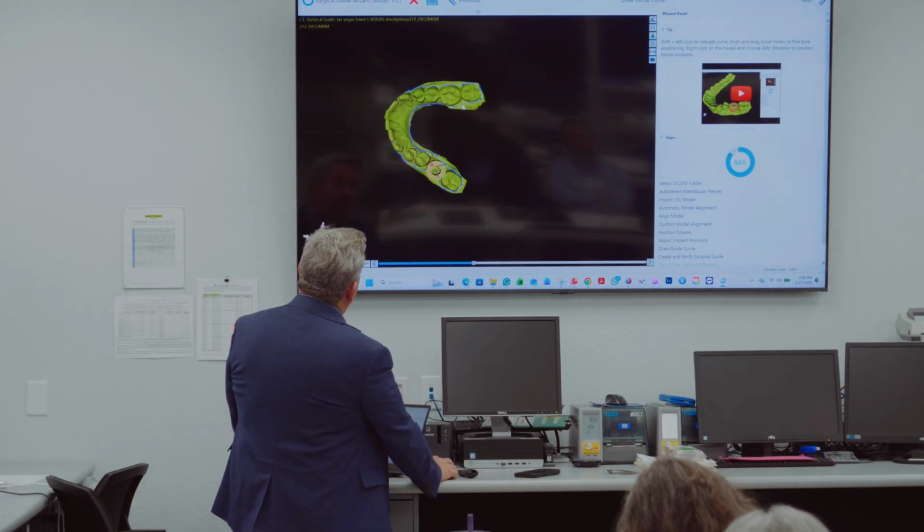Excuse me. I don't know why I'm moving it there. Oh, there it goes right there.